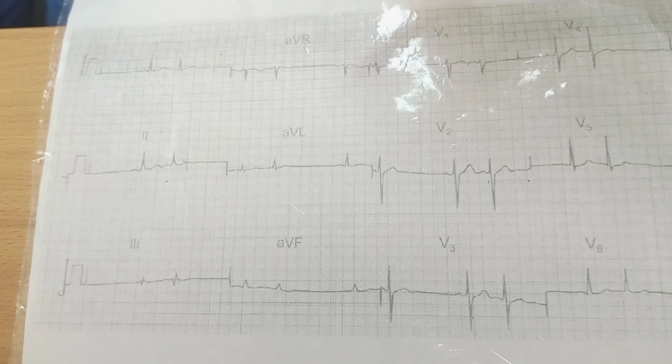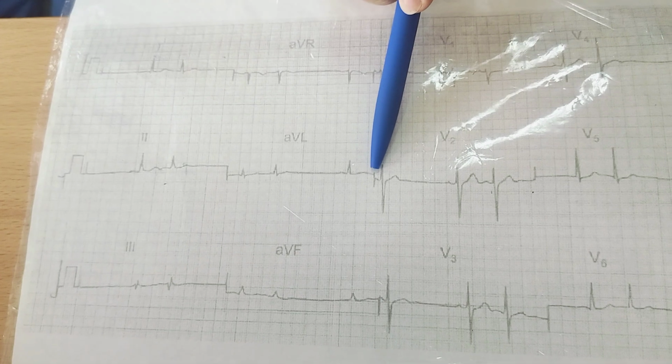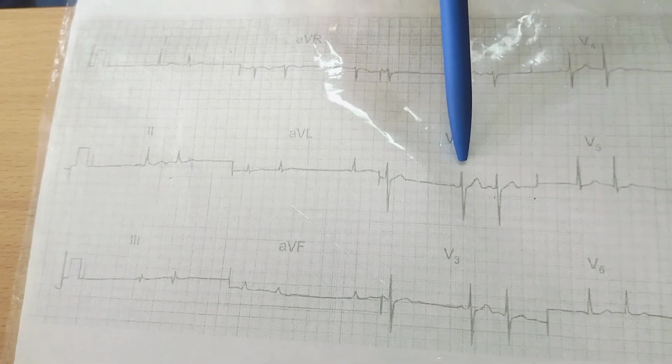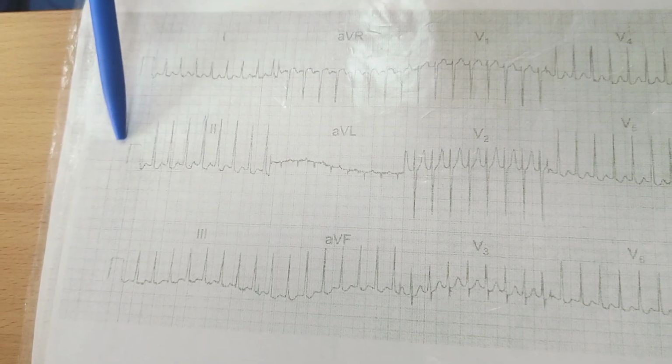I will not give it on the control, but it's possible supraventricular extrasystole because of the short interval of connection, long distance, and the complex looks the same as the previous one. Quality is okay.